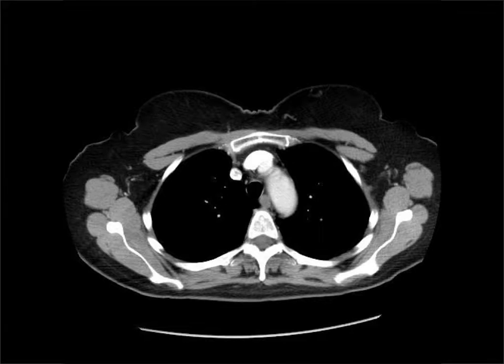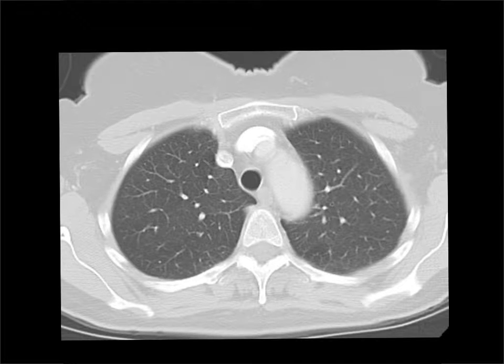Now let's look at a CT scan. So we've got the trachea in here, and you can see that if you look to the right side lateral to the trachea, there isn't a whole lot of stuff. Now this is being shown on a mediastinal window, so I'm just going to change for one moment over to a lung window to show you. So this is a lung window, and you can just see there's a little bit of fat running in that right paratracheal region, as well as the tracheal wall, but virtually nothing in there.